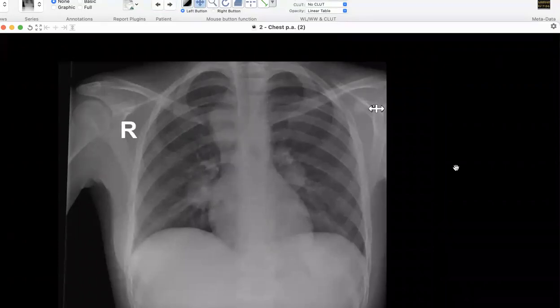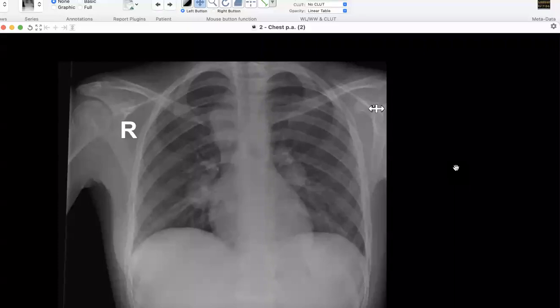What do you see now, after treatment of post-infection? Yeah, possible infection. Well, there are bilateral hilar masses, and there is enlargement of the paratracheal shadow. This gives me the impression of Garland triad, which is evident in sarcoidosis. However, in the history of this patient, there is infection and treatment accordingly.